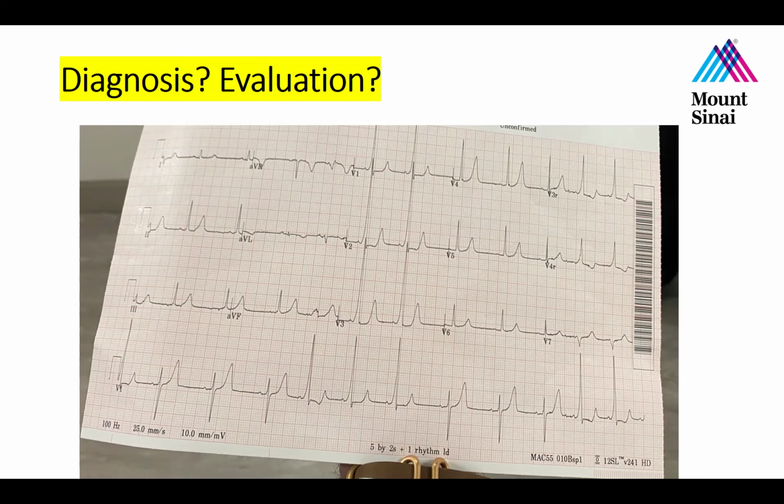This is a patient similar to our patient that we discussed last week, who has intermittent pre-excitation. Do you want to hazard a guess as to why this patient might have intermittent pre-excitation? You get extra credit if you get this one right. I think pathways that have intermittent pre-excitation are lower risk pathways.